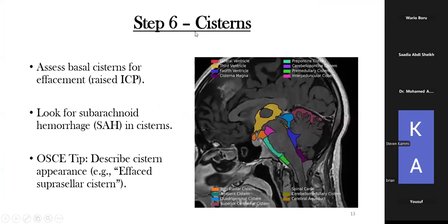Look at this. This is an MRI. You see the MRI over here. What you have is the bone. Look at the bone here. This is the bone, this dark area. You don't have that classical bone or skull that appears. This is soft tissue. Remember, your bone does not go down to the neck. So in an MRI, you don't have that classical surrounding hyperdense area that is over there.